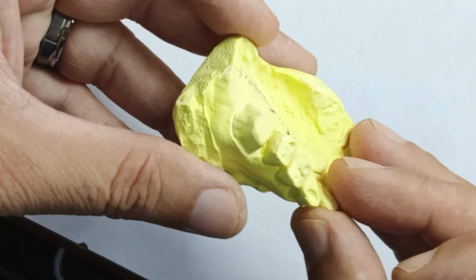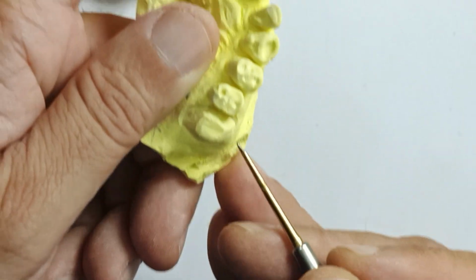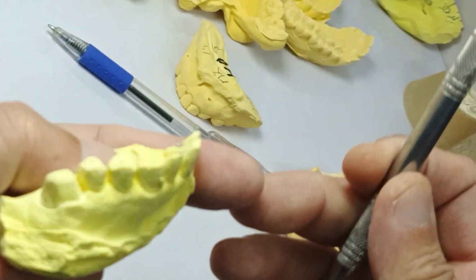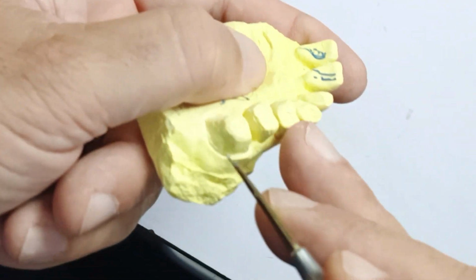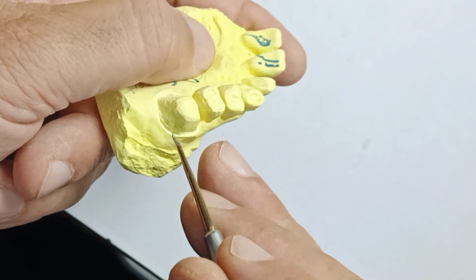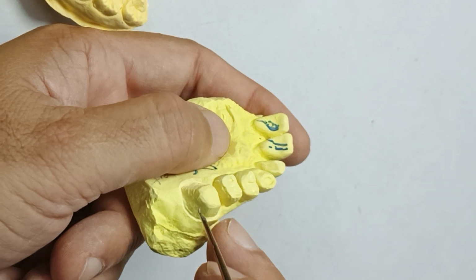Take another case. What is this crown? The lab had to cut the margin. You see? What happened? What is this? There's no occlusion. And if you take a look from the side, how much is the reduction? Which way are things going? And invariably I see burr marks on the adjacent tooth, because whenever you prep this, you cut the side tooth. Is this how the prep is done inside the mouth in your book? Would you like to have somebody do this kind of prep in your mouth? Or your mother or your father or your brother or your wife? Would you have that? I seriously doubt it.